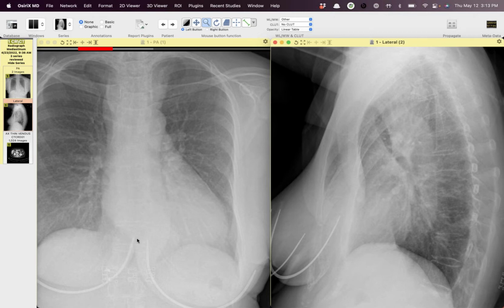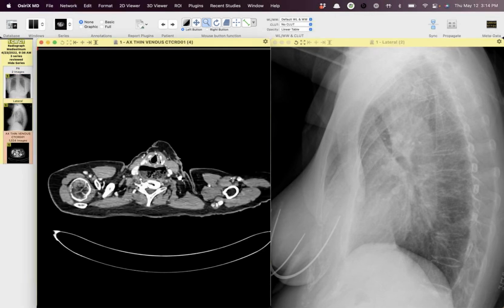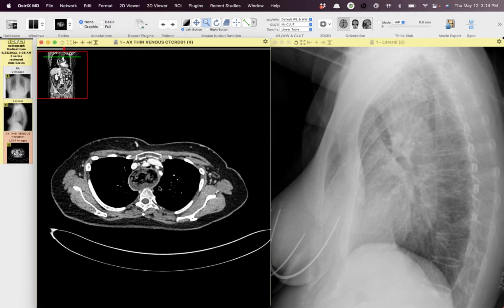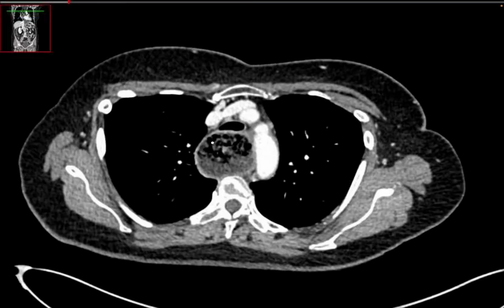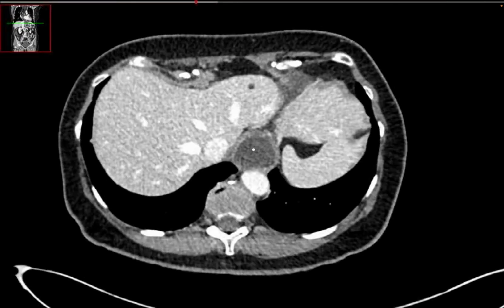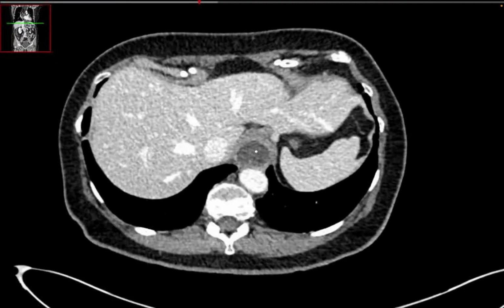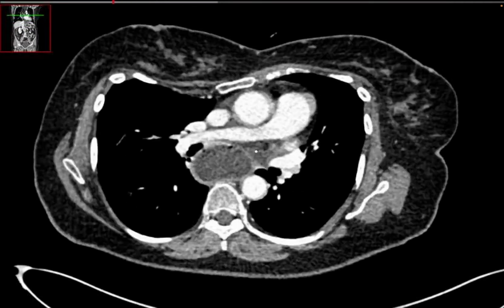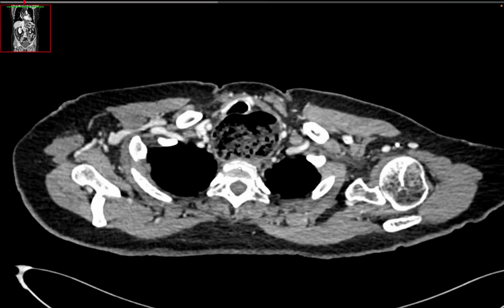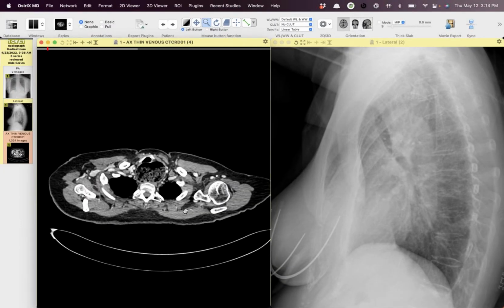And then of course it extends down into the azygoesophageal recess. You can see on the retrocardiac clear space on the lateral view there is also something here in addition to the aorta, which is more posterior. This was actually an older patient who did not have a diagnosis of achalasia, but you can see the amount of mass effect on the trachea here on the CT, and I'll zoom in on that. Considerable mass effect, and they did scope the patient just to ensure there was no obstructing lesion down here, and there was just some chronic reflux esophagitis. I think this woman was in her 60s and was diagnosed with that. So kind of an unusual late presentation, and I don't know how long her symptoms were actually going on, but a pretty dramatic example. Yeah.